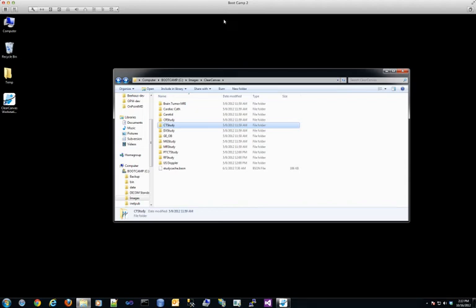Hello, this is the second video in a four-part series discussing the OnPoint Study Analyzer tool. This video will be focused on basic functionality, specifically revolving around DICOM data exploration.